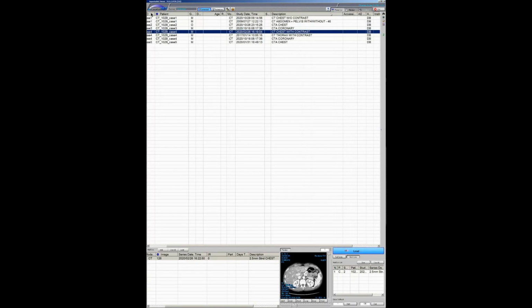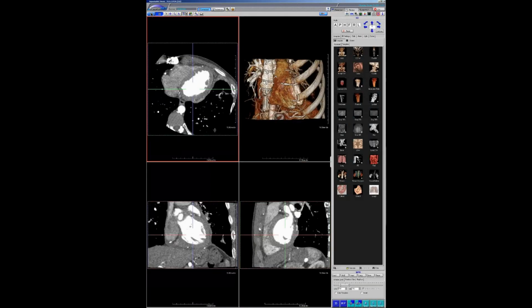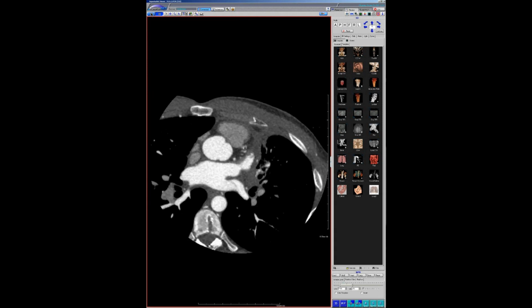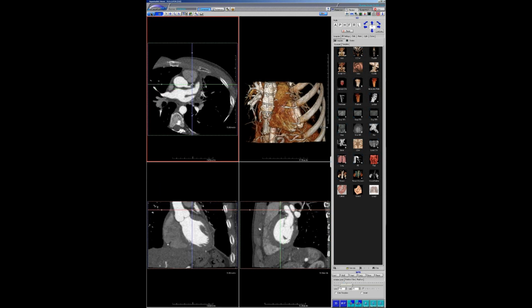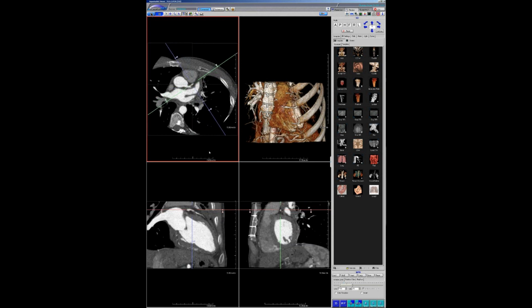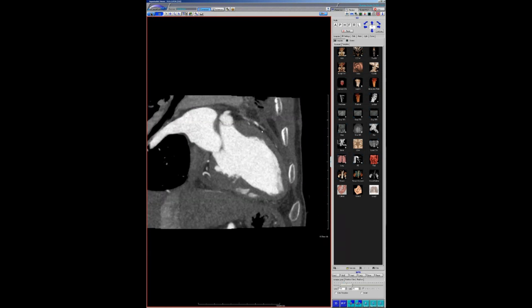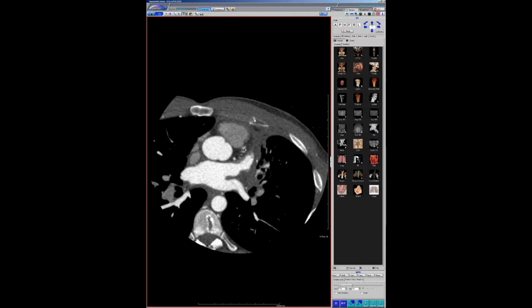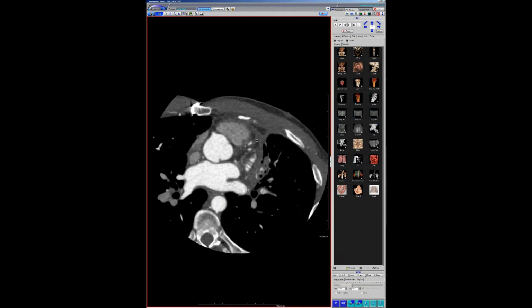He's got the LAM, and I have to say, it's variable, but most of the LAM I see with TS patients tends to be not as severe as I see with people who just have LAM versus the TS-related LAM. Again, that may be not true, but that's just my own personal experience. And then he has all these nice ground glass nodules all over the place from these areas of multifocal, multinodular type 2 pneumocyte hyperplasia, and these nodules have been stable for many years. Just a nice example of all the findings in TS.